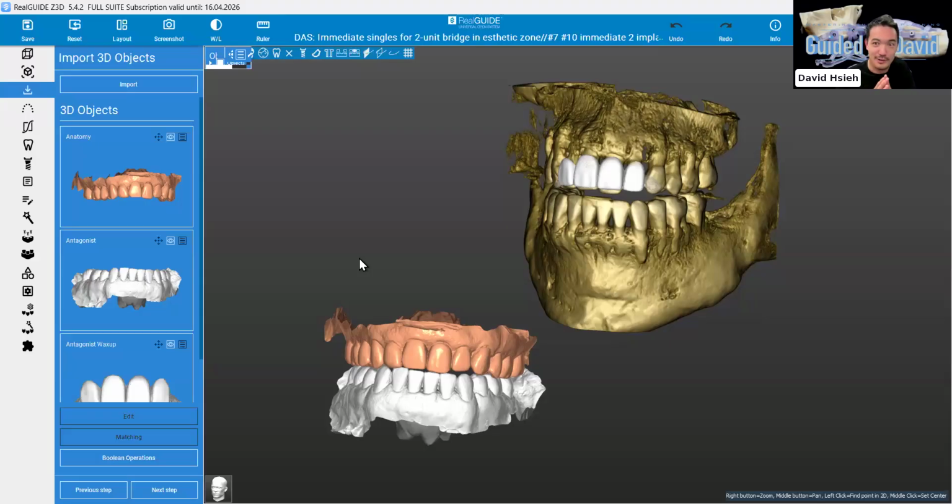So in my entry-level guided surgery course, I should mention, which I'm going to do right now, that guided surgery is not 100% accurate. And there's a lot of reasons for that because, in guided surgery, as you can see now, there are so many steps to get there, right? The CT scan, the intraoral scan, and the merging, the designing, not to mention the surgery itself. Each one of the steps will have deviation. It's systematic. You can't get rid of it. It will stay there forever, right?